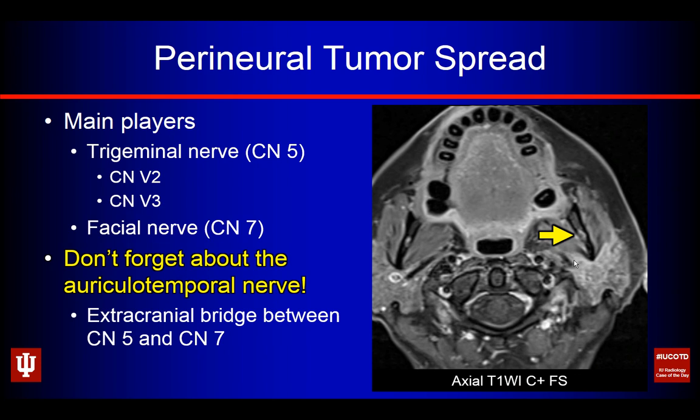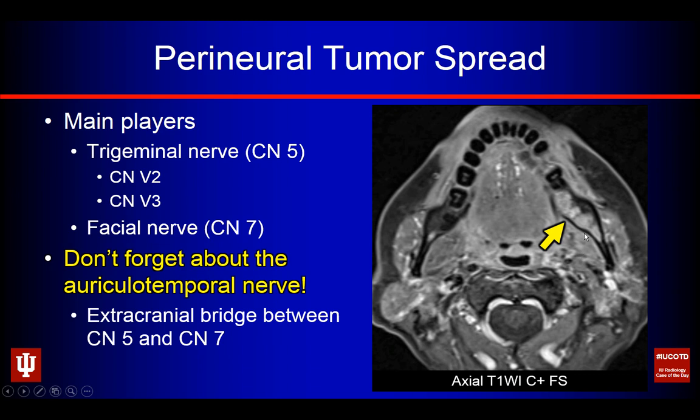We're now at sort of the lingula of the mandible, where the mandibular nerve is going to enter into it, and we can see asymmetric enhancement. It's enlarged. We're starting to lose the cortex around it. See how we've, along the anterior margin where that's enhancing, we've lost our dark cortex. It looks a little shaggy through here compared to the other side where it's smaller, and we can see that dark T1 dark rim all the way around the foramen. So that's been infiltrated with perineural tumor spread. Let's go a slice or two down further south. This whole marrow space of the left mandible has been replaced where it's extended along the mandibular nerve canal.